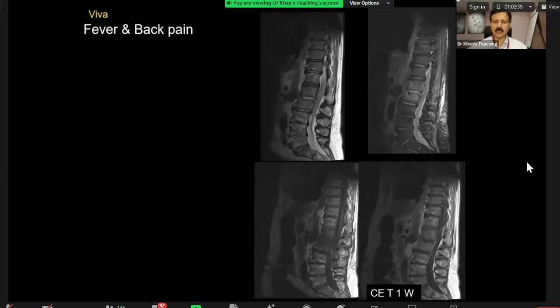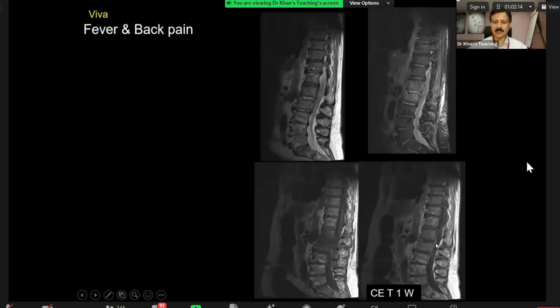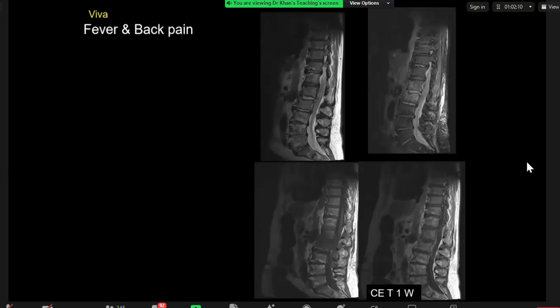So the clinician says, can you drain it for me? This collection is located anterior to the spinal canal. Now we're at the level below the conus. My question is basic: is it drainable? And I don't think it's drainable.